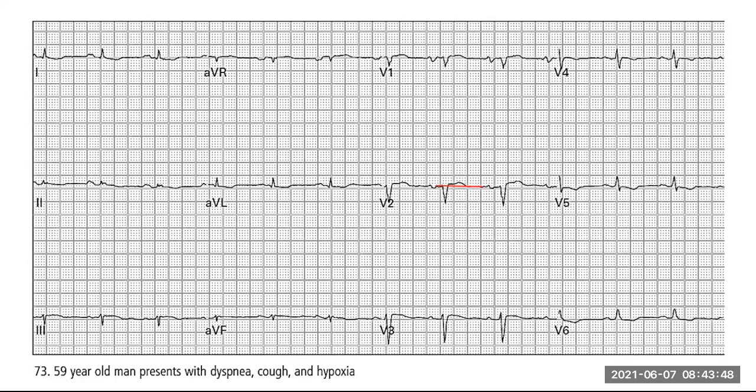And remember, this is a very sick patient. This is not somebody who you're just admitting to the ward. Or if this patient was going, for instance, to COVID ICU, you'd still look at all these things. Agreed. So that's what we're just trying to pick out. So we're just trying to look at all of that.